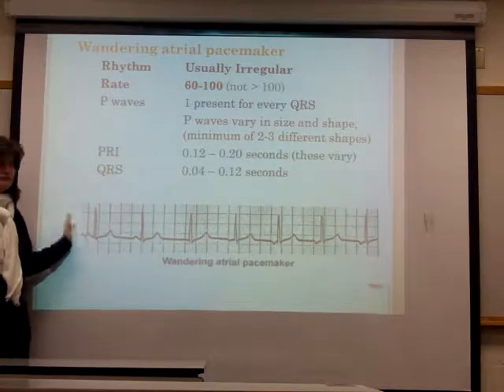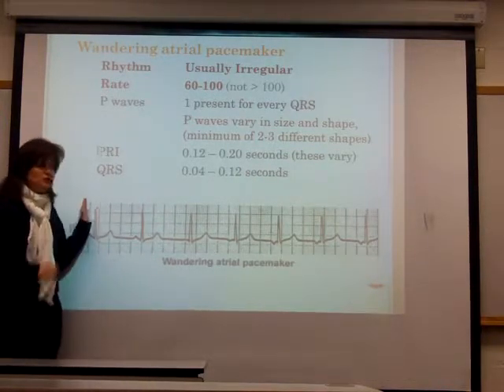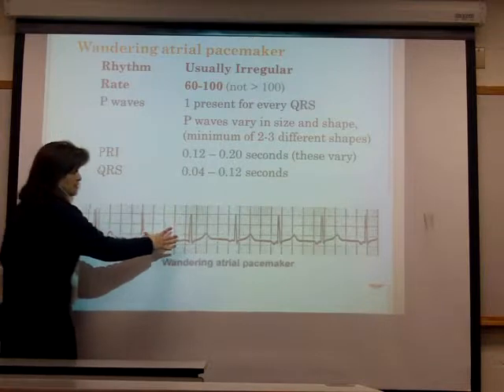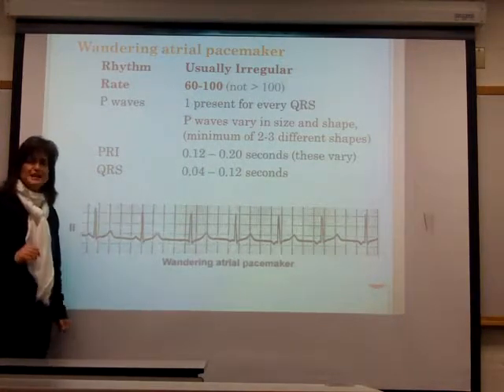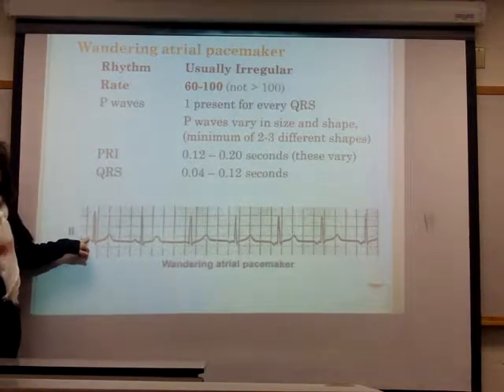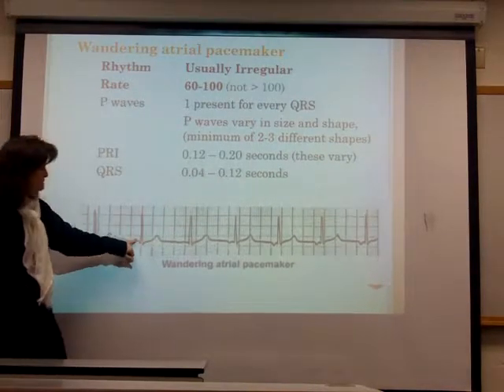Again, start at the left and go all the way over. This is the classic reason why you go all the way to the end when you're looking at every single aspect of an EKG. So when I check regularity, I notice it probably goes off a little bit here and there. So I'm comfortable saying it's slightly irregular, but nothing worrisome. I look at my P waves, upright, 1 for QRS, fine. Looks just like the other one.